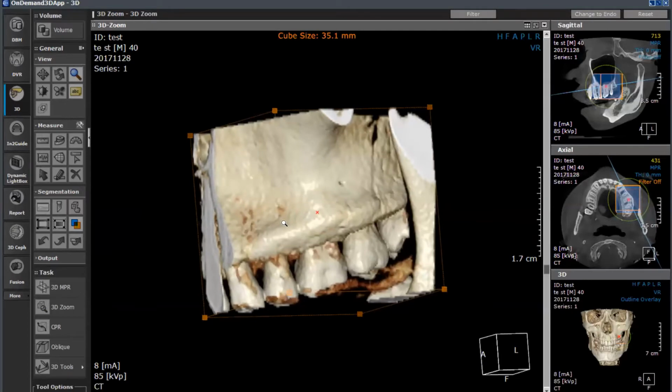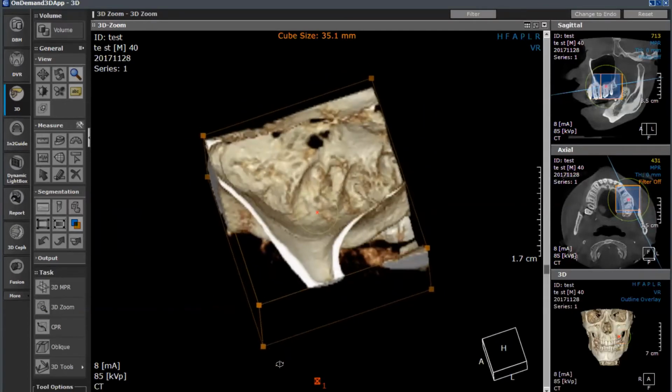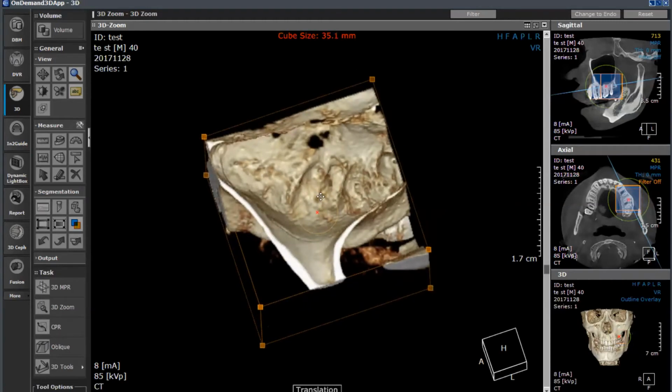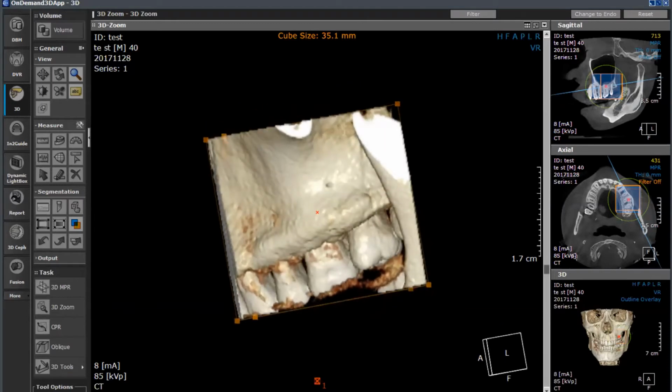Once you get in that high-def 3D image, that you can right-click to turn it, you can actually look inside the sinus as well. This gives you the view in case you're doing something like, say, a sinus lift for an implant, what have you. But this also gives you the ability to see its interaction with the floor of the sinus as well. When we're looking at that, we look at it in the bone window.